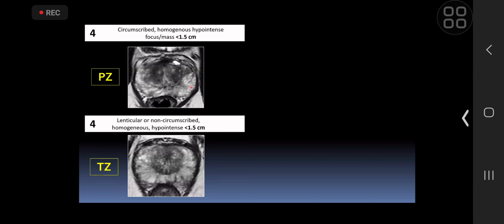So let's move on to what tumor looks like on the T2 weighted imaging. So as we said, peripheral zone, transition zone, we're looking for slightly different things, but ultimately we're looking for a focal area of low T2 signal intensity. It's just much harder in the transition zone because the background is different. So if we look here, I've highlighted those two areas there. You can very much appreciate that that's more homogeneously low T2 signal intensity when I take the outlines off. But importantly, in these two cases, less than 15 millimeters. So not at that threshold to be a score 5.